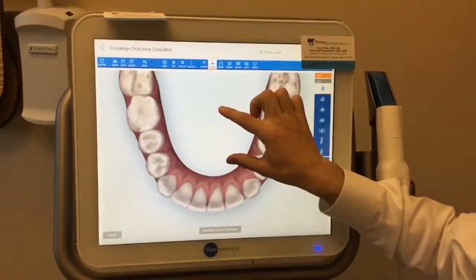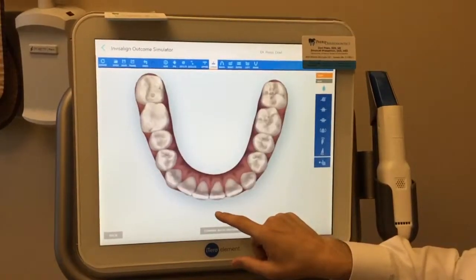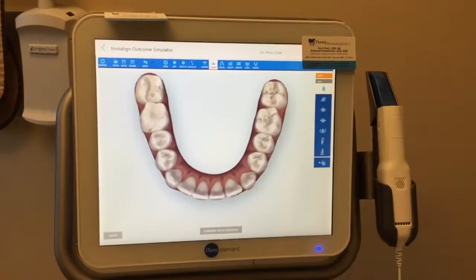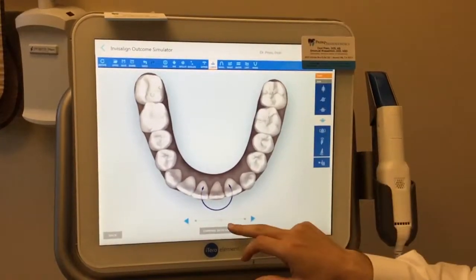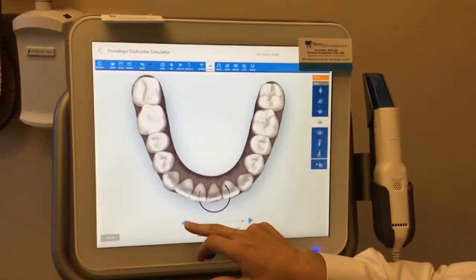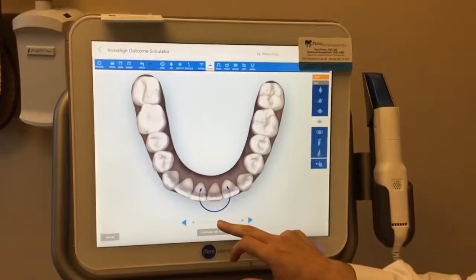Now very often also what I'll do is I'll go ahead and grab one of the teeth here, because especially the lower incisors, it's very easy for them to visualize, and so I'll say, well, imagine if we could move the teeth. Wouldn't that be nice? And we'll grab the tooth, and then I'll grab the rotation tool, and I'll show them, see, this is what we're doing. It's before it's like that, or it's really off like that, and now we're putting it like that.